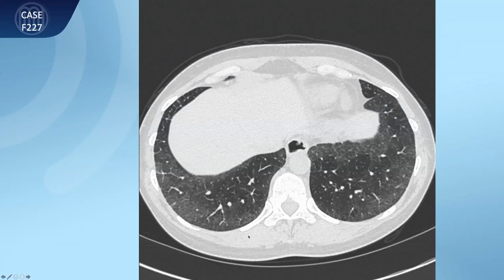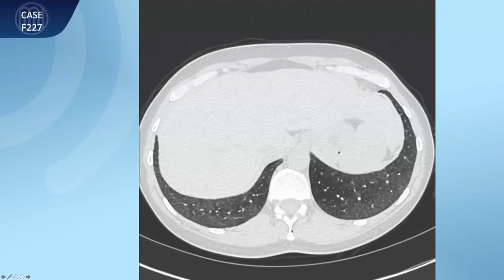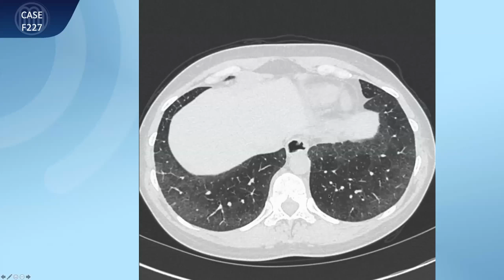Now looking here for signs of fibrosis, I have trouble identifying traction bronchiectasis. Probably here in the lung periphery, I don't know. My screen is very small. In the lung periphery, you also see some slightly enlarged bronchi. However, knowing that this patient has no acute symptoms and has a connective tissue disease, I have every right to call this a fibrosing lung disease.